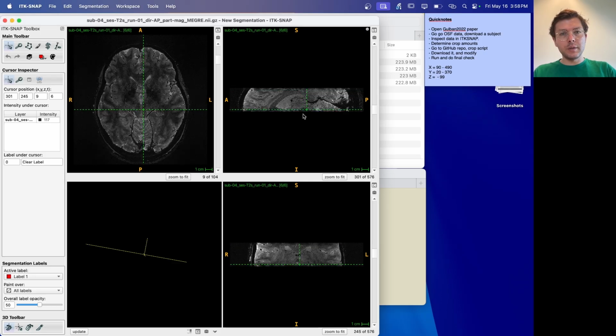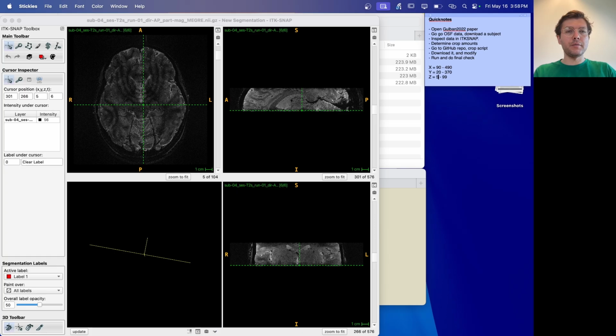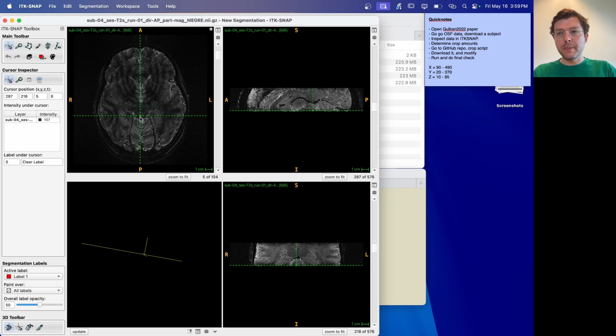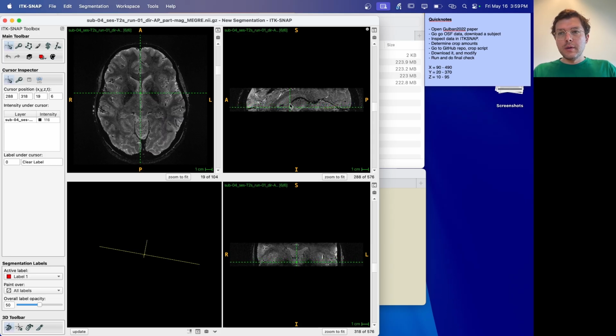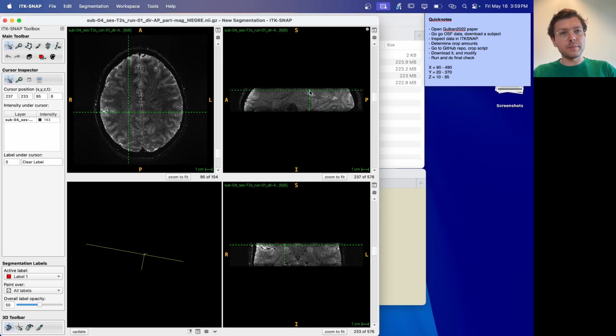And the minimum, let's have a look from the bottom side. Again, maybe we just cut 5 of them. Let's say 5 to 99. I mean, this can also be 10 to 95. Let's be more conservative for now, just for demonstration. Okay. Let's see. 10 looks pretty good. 95 looks pretty good. No more artifact visible.